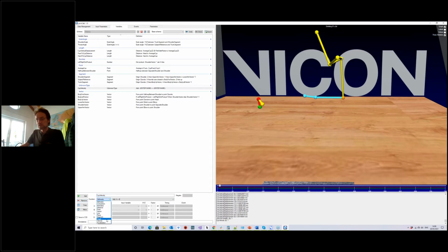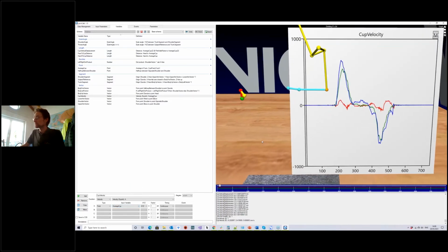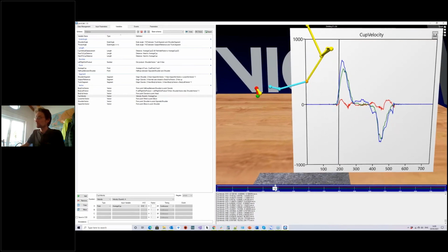And in this case, we have the velocity function, of which there are two velocities and two angular velocities in case you are calculating an angular velocity. The 5-point function uses a 5-point numerical function, and the other one uses a 3-point. That's kind of not really important. I always use the 5-point. And this is what you get. So you get a vector that has 3 components, which is the velocity in x, y, and z directions, like this.